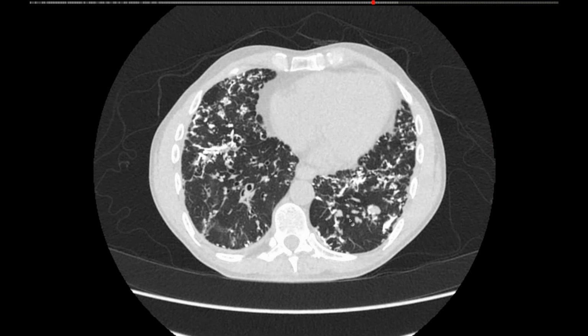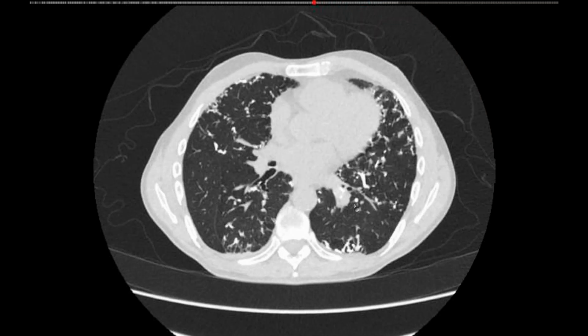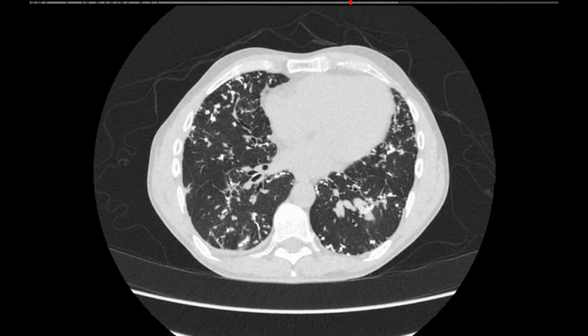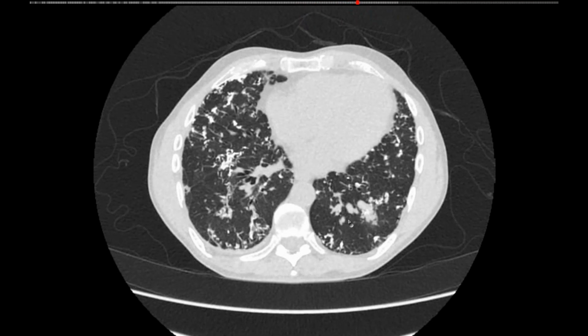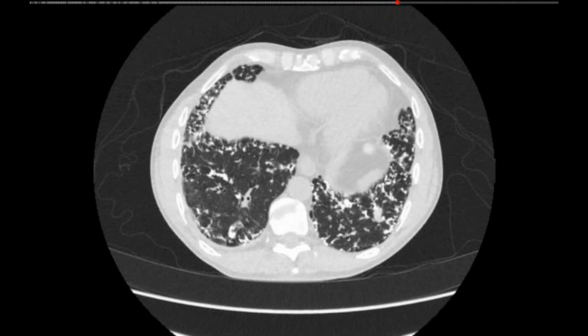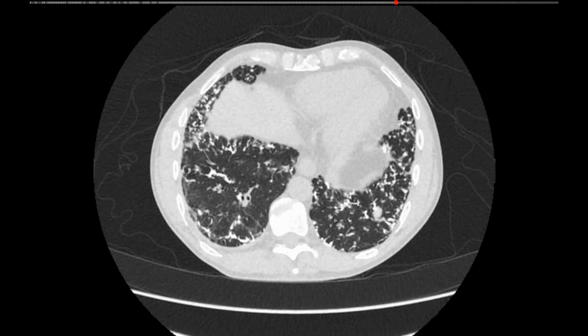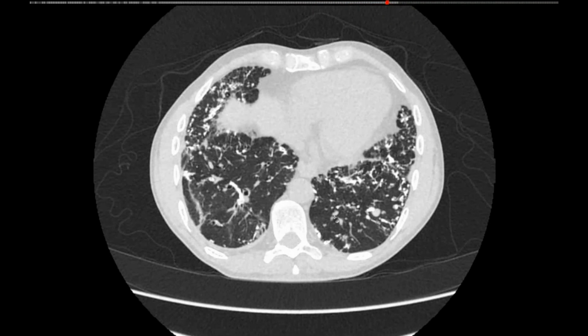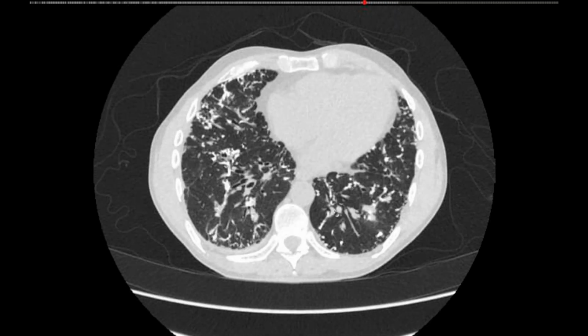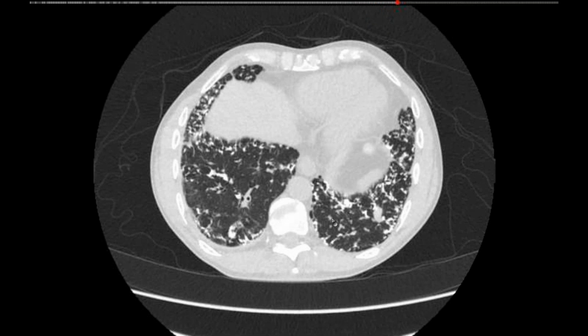I do see some airways with material in there, but I think that's probably separate from that, because the calcifications are everywhere, even though there are some airways, now that I look more clearly down here, that do contain intraluminal material. So while a person may actually be an aspirator, I don't think it accounts for overall what we see.